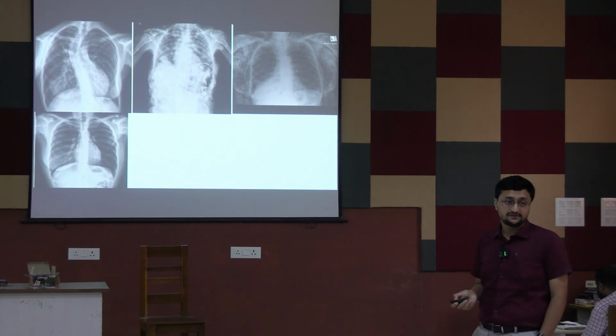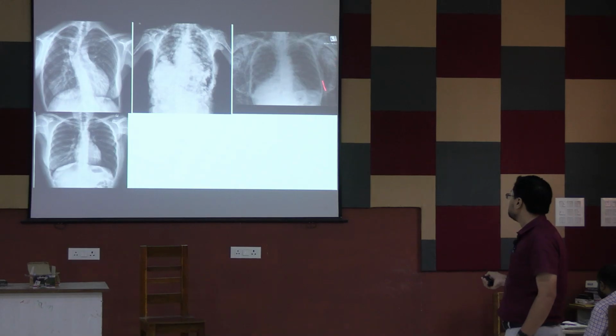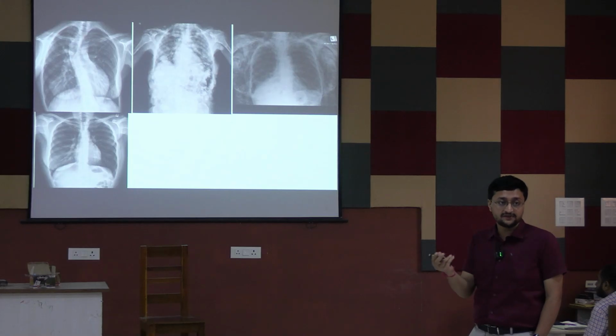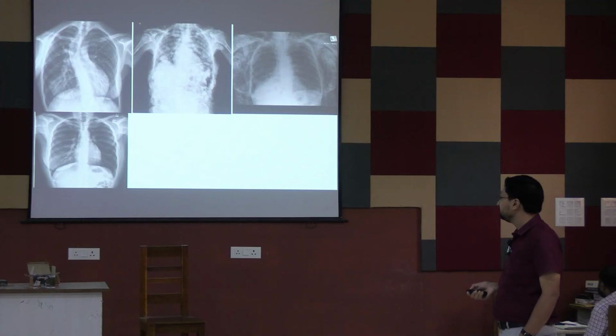This is neurofibromatosis. These neurofibromas are the neurofibromatosis shadows. And these are black shadows, multiple black shadows in the soft tissue area. Surgical emphysema, as I said earlier, subcutaneous emphysema, air trapped in the subcutaneous space. And is there any abnormality in this X-ray?